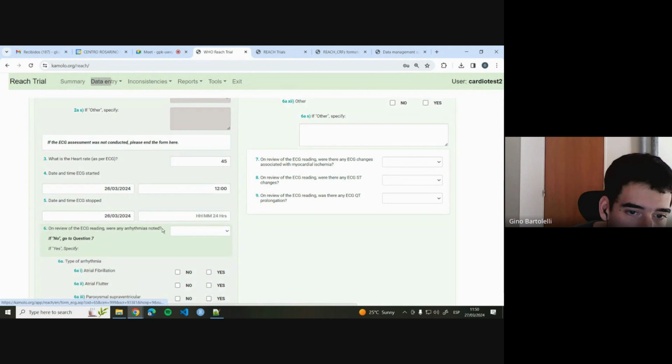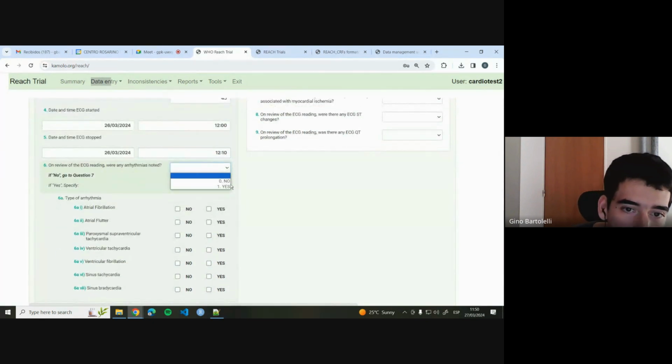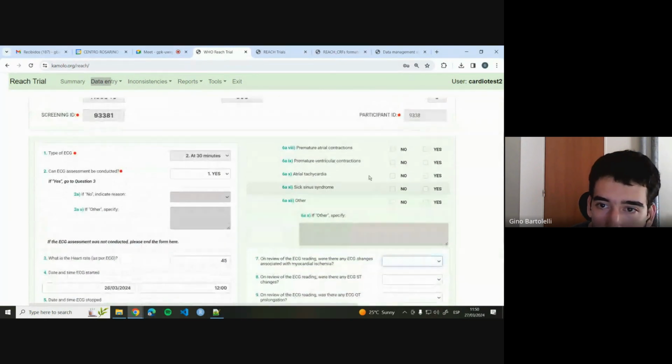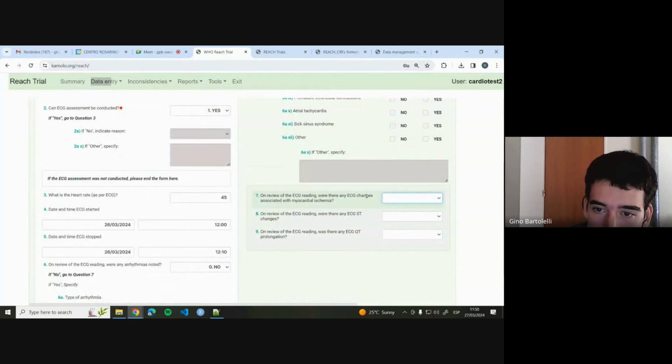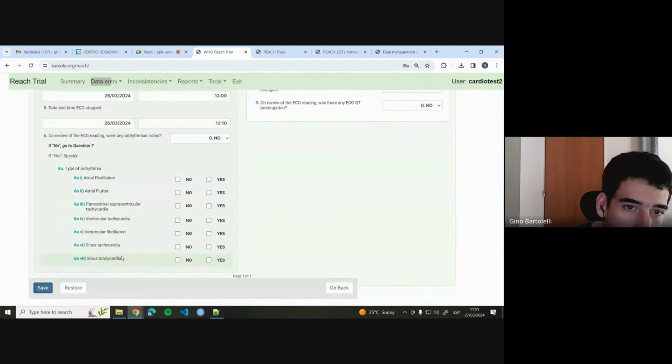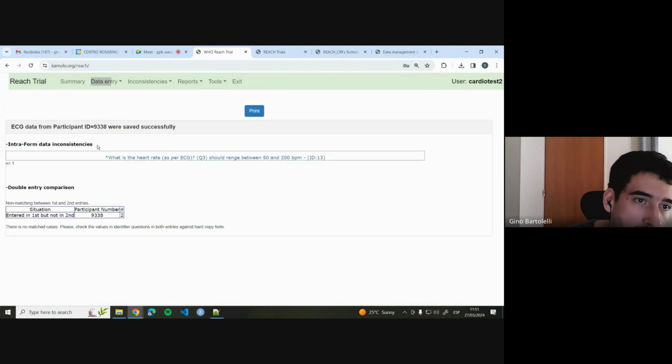When the ECG stop, when this is yes. Arrhythmia, I'll say that we didn't detect any arrhythmia here, so the answer is no. So we jump to question 7 and say that we didn't detect anything else here, so no, no, and no. So we save once again.